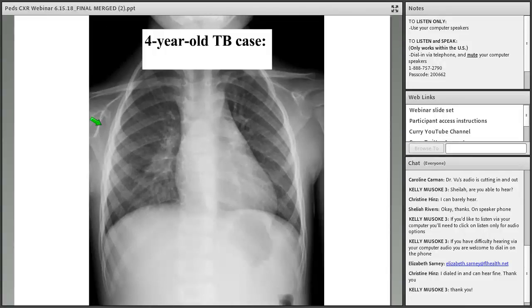Now, let's move on to evaluate a few cases using our systematic approach. On this frontal chest radiograph, you can see that the hilar region is not tapered like a carrot, like what I just showed you. It's very bulbous, looking more like potatoes than carrots.